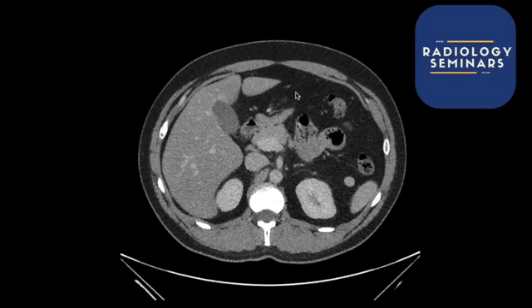If you've got someone who's got a perforated duodenum, usually you'd have a lot of air in the upper abdomen. So what density is air? It's going to be this density here. All the stuff that's sitting outside the body is air. So you may have that low density stuff sitting inside the abdomen. And if it's very predominantly within the upper abdomen, I would almost say 9 times out of 10 is going to be a perforated duodenal ulcer.